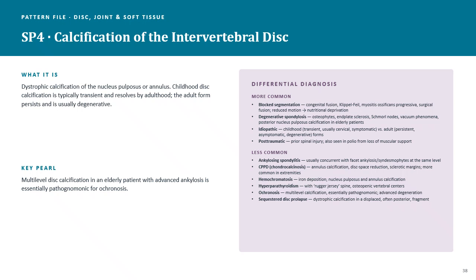Normally, we should not see any type of calcium building up inside of those cushions. So when a disc does actually become calcified on an X-ray image, it will look or appear whiter or more radiopaque on the image. Now, the first thing that the doctor or the radiologist considers when they're seeing this type of calcification is the patient's age.